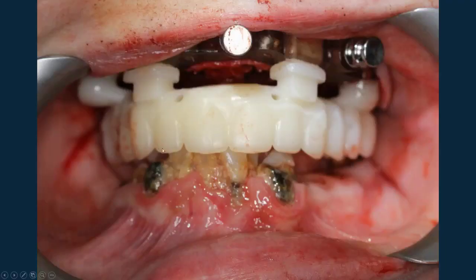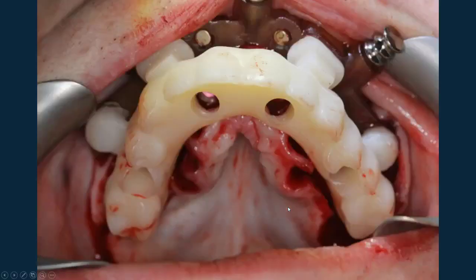And since we'd already made an immediate load prosthesis, we took a picture with it in, and hypothetically this would have aligned it to her facial planes and made the pickup really easy. You can see the contours are nice, ovate and convex, but alas, we didn't get primary fixation, so we had to scramble and figure out an alternative.